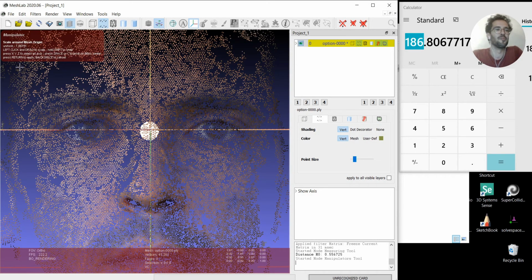And okay, so we are pretty close. I think it's enough. 1.867, so it's really close. Just change 1 unit here and enter.